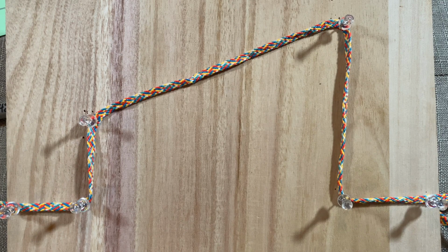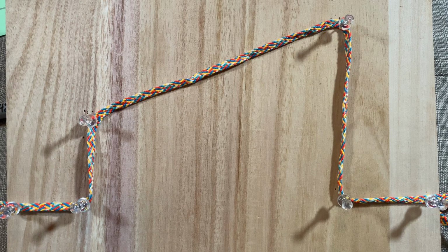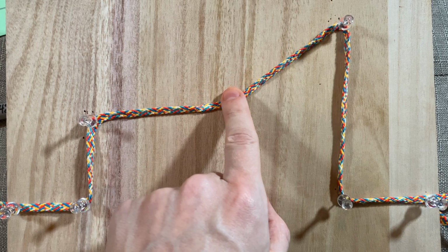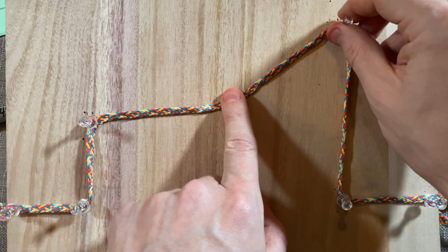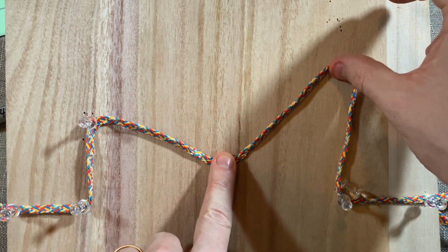Now, what does it look like when the patient starts to make effort? Remember, we're not controlling pressure here, so anytime you're in a volume control mode, you should look for what the patient's doing in the pressure waveform. A passive patient will look like this. A patient that's making effort will start to pull that waveform downward towards the baseline. So initially, it could be a small effort and look something like this. But as things progress and the effort gets higher and higher, this waveform can actually get deflected more and more.